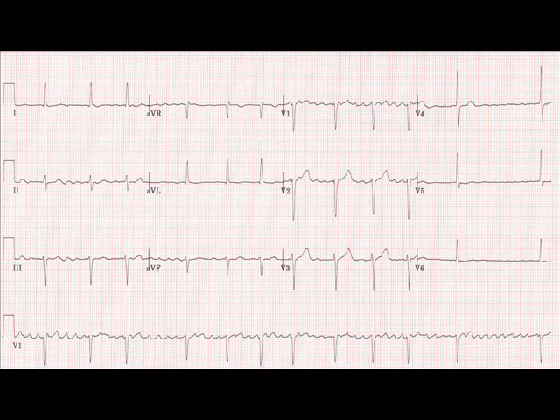And imagine that this has been handed to you by a colleague in clinical practice who says, "What's on this recording?" which is a fair question. Well, to answer that, work systematically. First of all, ascertain that it has been recorded accurately. And as you know, if you're in any doubt and you're able to, re-record it. Is it a clean trace? Certainly is. The lines are nice and sharp and clear, and they progress horizontally across the paper.